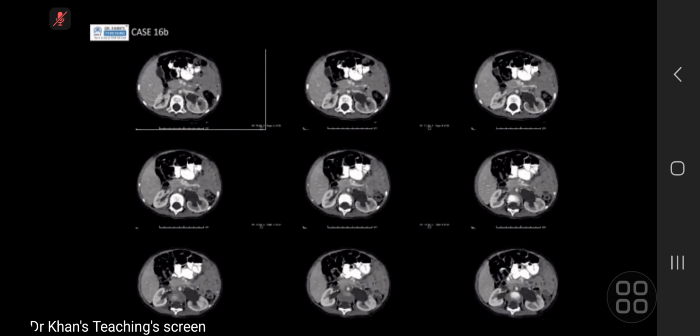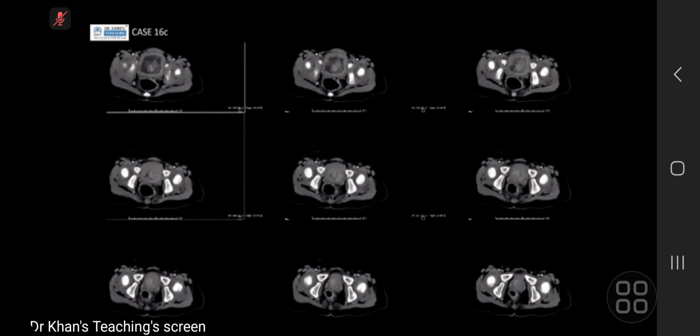Yeah, these are the contrast CT images showing evidence of a dilated pelvicalyceal system and ureter on the left side and also on the right side. Okay, I've got another one. And the previous findings that are seen on ultrasound, there is a heterogeneously enhancing polypoidal mass lesion within the urinary bladder causing upstream hydroureteronephrosis. I think the age of the patient is 7 years old. Yes, right? No, 1 year old.